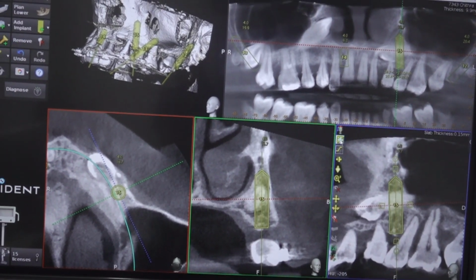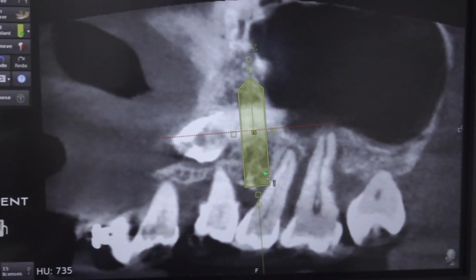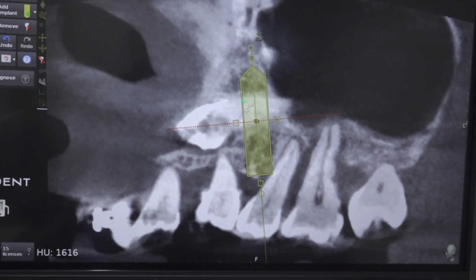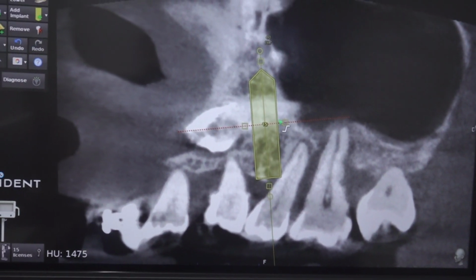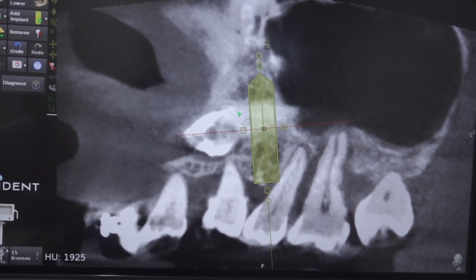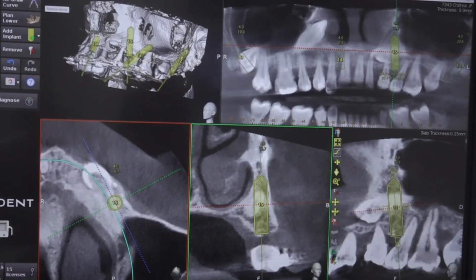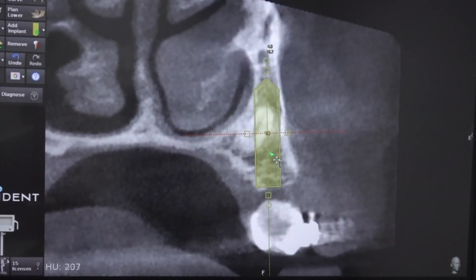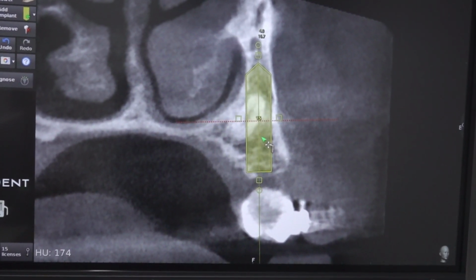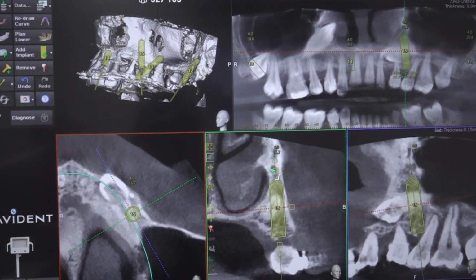So between 4 and 5, we can place this slightly tilted implant. So here only the root socket will come, which will be very little instead of the crown area where the defect will be more. Or one more thing we can do is remove only the canine and leave the root, and we can go through the root. We get excellent stability, right? We can drill through the root. That is also possible. So this implant looks good.